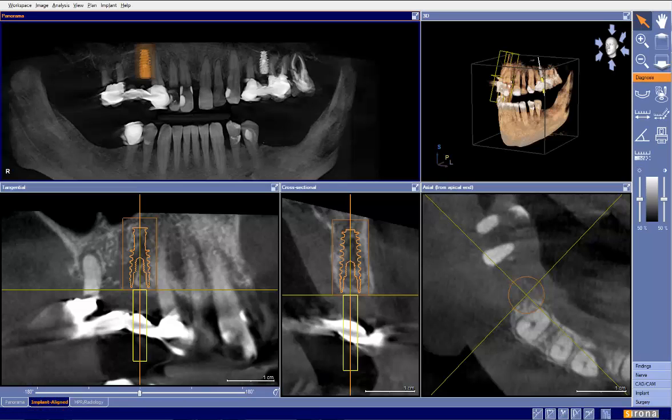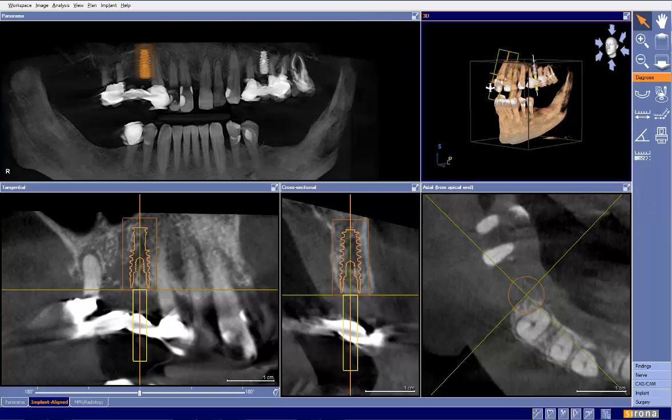Okay, we have another case submitted here, and in this particular case, it's a little bit of an interesting case. The patient has existing bridges in the upper right and in the upper left-hand side. The terminal teeth on these bridges, the abutment teeth, need to be removed due to infection, decay, and the various things that we see happen to endo-treated bridge teeth over time.